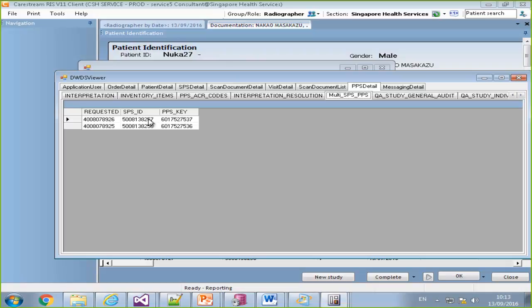So the final result would be the result of the link manager as if they weren't documented together, but just moved the status. The logic remains the same. We didn't want to try to link the two of those. So your technologist or radiographer can do it as two separate actions, and probably should.